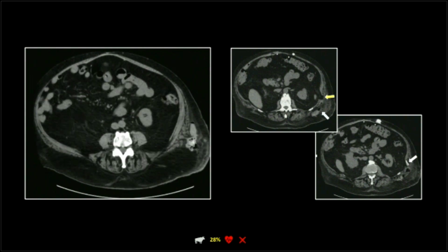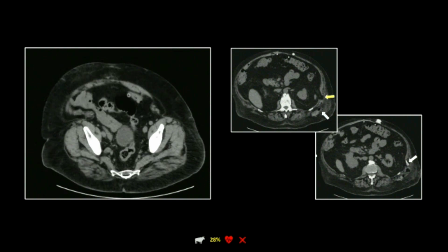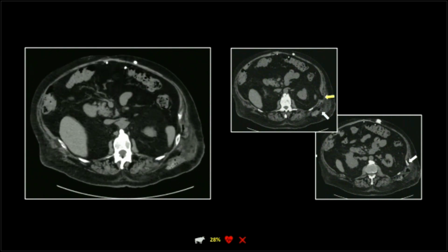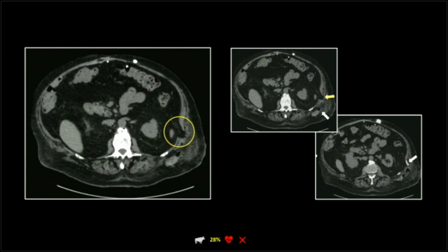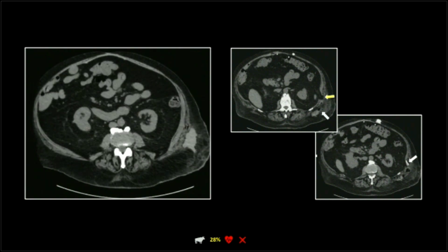But isn't that incredible? The tip of a bull's horn broke off in this guy. And so that's mostly manure you see in his soft tissues. So that is a dirty wound. But there it is, the tip of it. You can see it's conical.